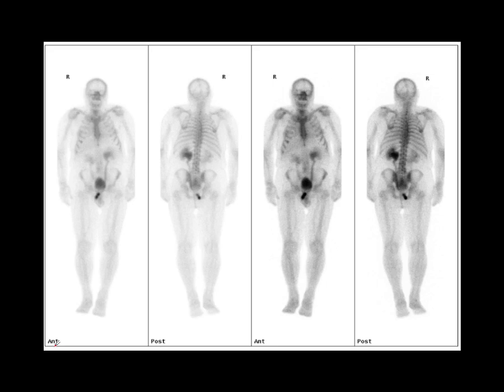So this is one of the most obvious soft tissue abnormalities that we see at bone scintigraphy. Now I think I mentioned back in one of my earlier talks that the tracer is cleared through the urinary tract. So here we have our bladder, quite a large bladder in this case, and we can see that both ureters are dilated and there's hydronephrosis. We can just vaguely see it here on the right side, probably seen a little bit better on the anterior view, but it's quite clear on the left.